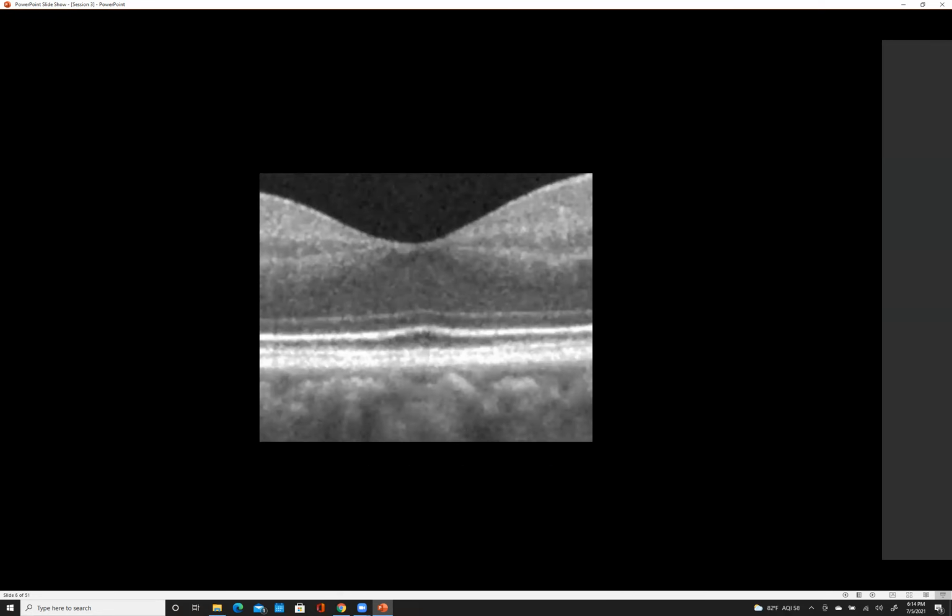So what we're going to do again is point, but this time I'm going to point to lines, and you're going to tell me if something is light or dark. We can call them bands, but because they're part of the linear parts of the outer retina, I'm just calling the whole thing a bunch of lines. So if I point to that one, is that light or dark? Light. Good. How about that one? Dark. Good. How about that one? Light. Good. And that one is light too.